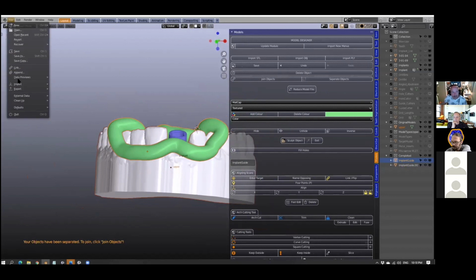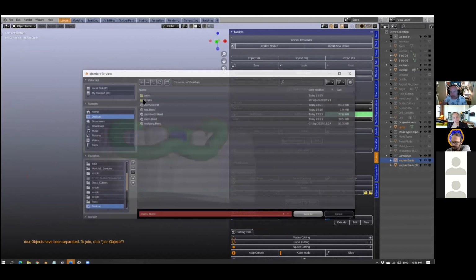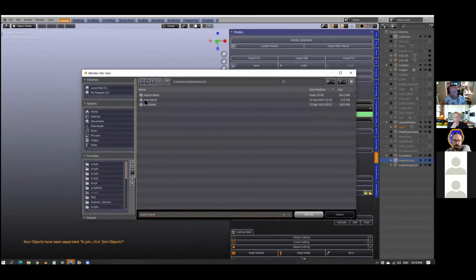Okay, we save it in a specific file, save as. I'm going to save it in my Zoom session, and I'll just put finish. So wherever you save your file, so this is desktop Zoom finish, save.